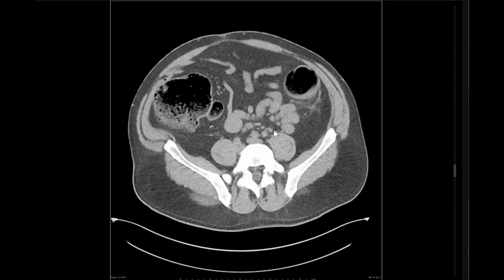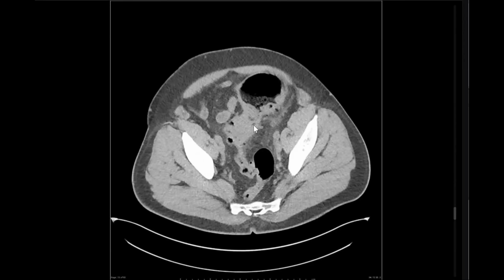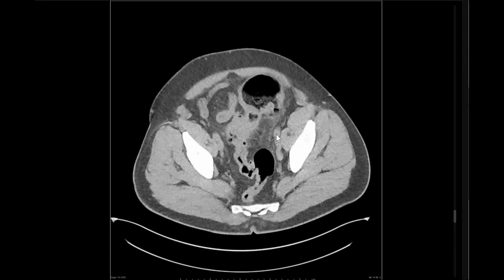Correlation. Is it cancer or just stricture? It was a stricture. This case is a diverticular stricture, not cancer. But you are correct. Colorectal carcinoma is more common than diverticular disease. But we have signs of diverticulitis. Very good, my friend.